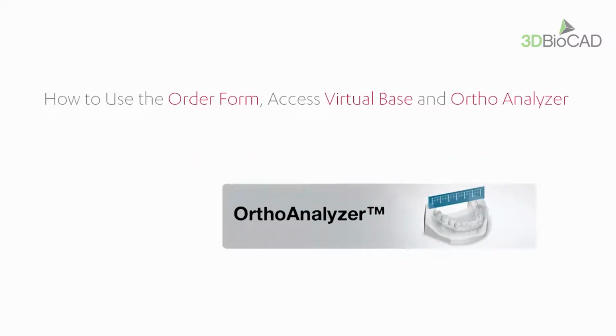In this video, you will learn how to use the order form, as well as how to access the virtual base feature and Ortho Analyzer. Now we will show you how to use the order form in Dental Desktop.